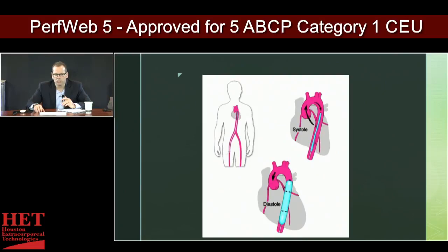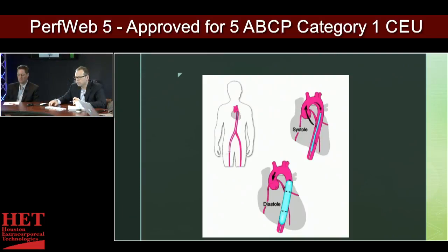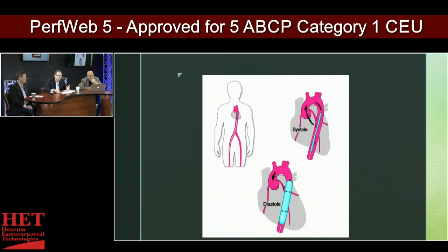And this is just a simplistic diagram showing you where the balloon pump should sit. I think important things to note on this is if the balloon pump is too high or too low, you start to impede upon the vasculature that comes off of the aorta. If it's too high, I think we talked about, it's going to be the left subclavian that's going to be interfered with. If it's too low, then you start getting into the visceral vessels, okay? If it's below the diaphragm, you have your celiac artery, then you have the superior mesenteric artery.